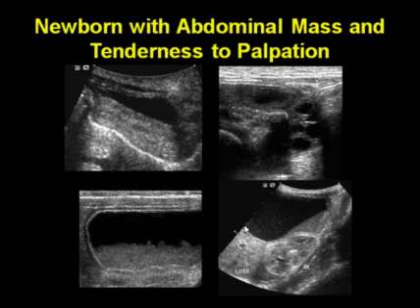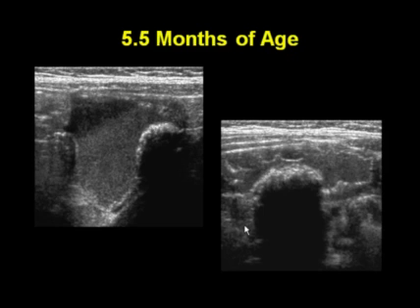The patient was presumed to have an ovarian torsion. She was followed conservatively. At 5.5 months of age, the cyst had decreased in size. It's quite irregular, and there's this mural calcific nodule with very intense distal shadowing, presumably the infarcted, now calcified ovarian tissue.